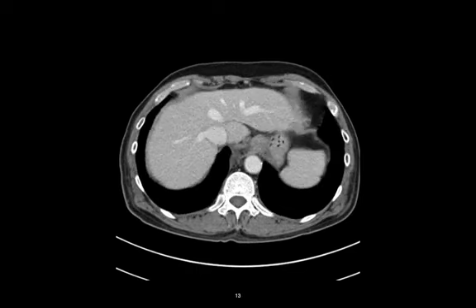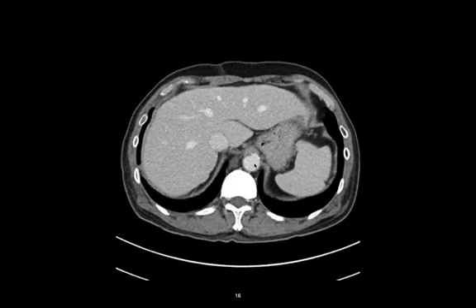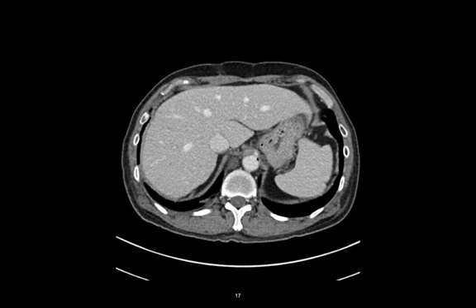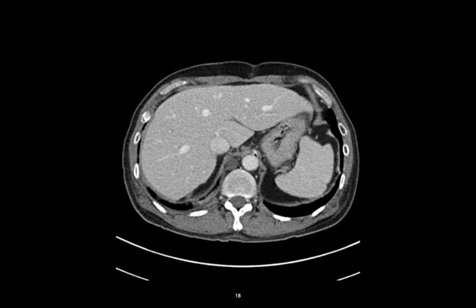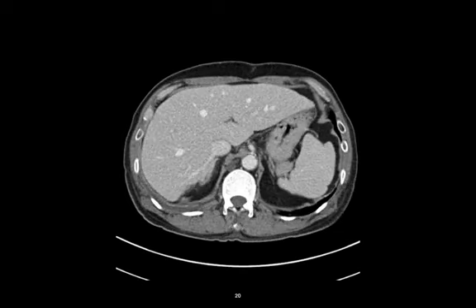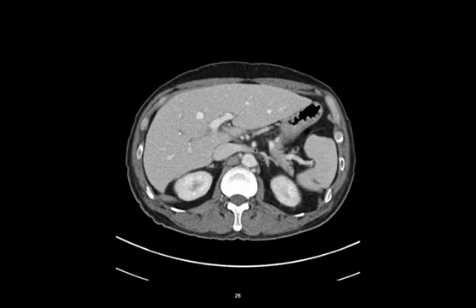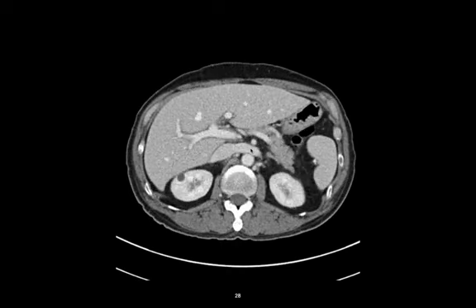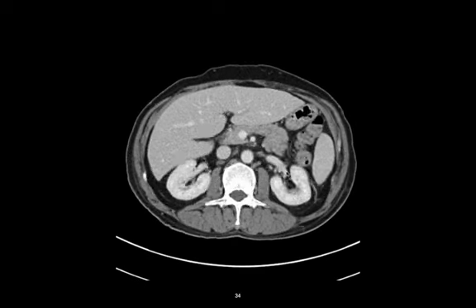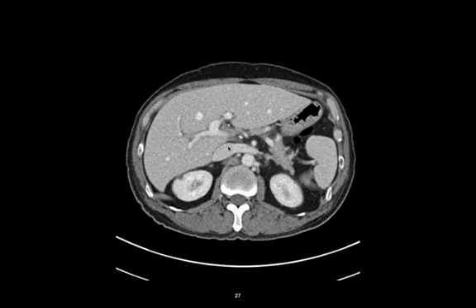We're going through the diaphragm right now, and you can see a little, I think that's atherosclerosis right there. You see that little thing that comes off? If I had more slices between each one, we'd see more, but that's the celiac going off. Okay, now watch. There's now the SMA, because they're so close to each other, and there's the superior mesenteric artery coming out. And I know that because the SMA courses over this left renal vein. And so if I follow that vein over to the left kidney, it goes between the SMA and the aorta, going to the IVC over here.